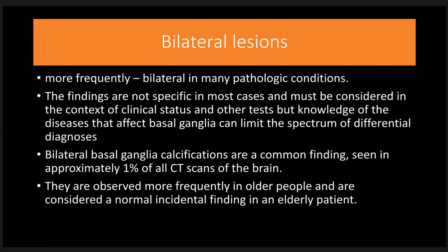Bilateral basal ganglia calcification are more common findings seen in approximately 1% of all CT scans of the brain and has more than 24 causes. They are observed more frequently in older people and are considered a normal incidental finding in elderly patients, especially the calcification and iron deposition.